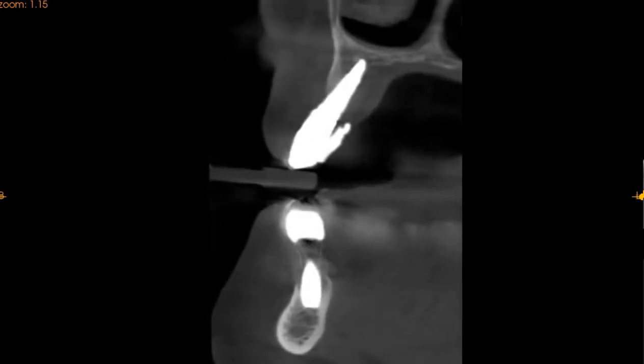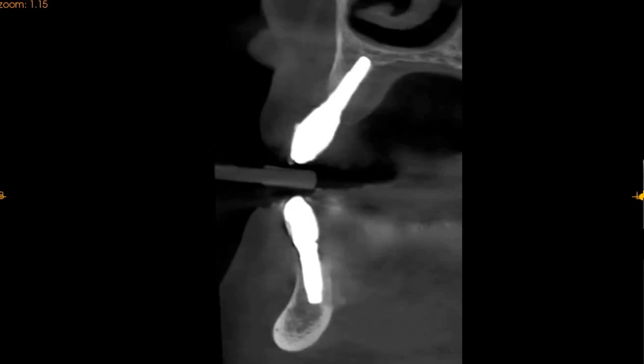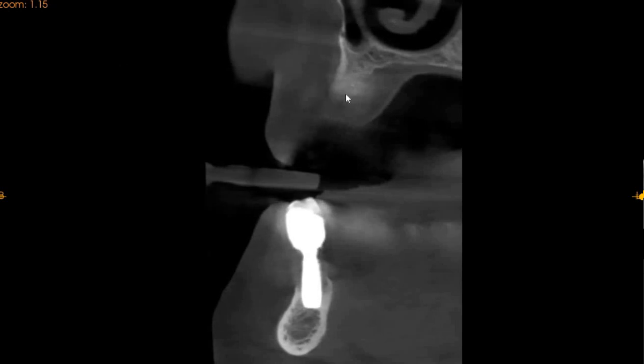This is the upper right hand canine region. This implant, unfortunately, is placed slightly palatally, so we can see right there. We've got good buccal bone around it, but there is very, very poor bone at the palatal section of this implant. This is very deep. We can see that on the buccal side there's no radiolucency around it. In the upper left first premolar region, we can see that we've got slightly appreciable bone present here. If we can show you here, that's the width and that is the length, 5.2 and 8.8 millimeters.